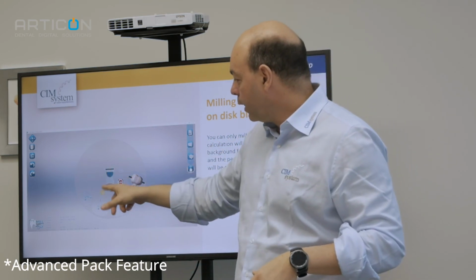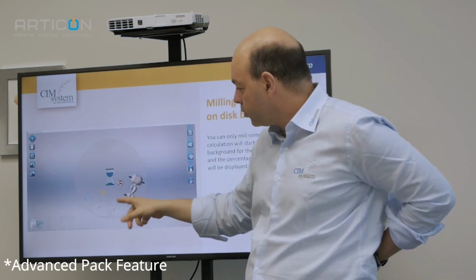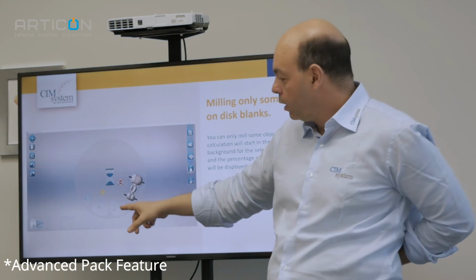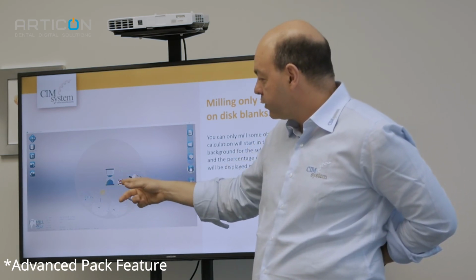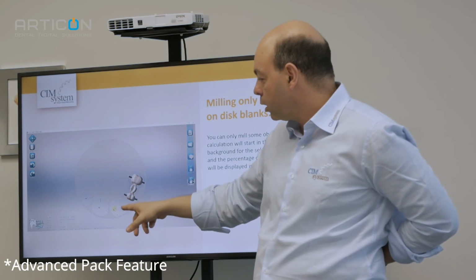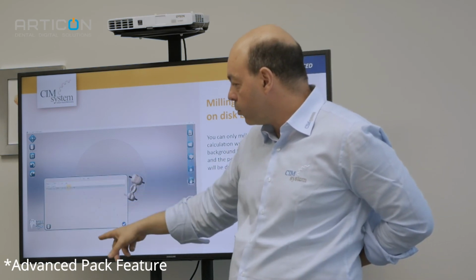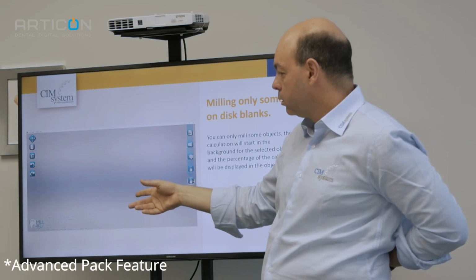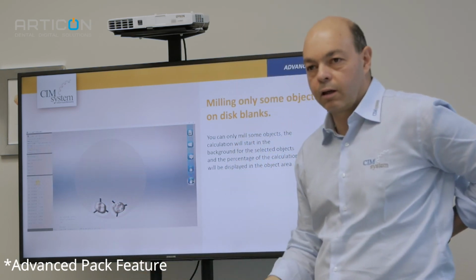Look, I have 3 calculated at the same time. This, and this. When I finish, everything is okay. He puts one check. If I need to check this project, it's easy because after calculation, I click here, and automatically I have the information. If I need, it's possible to open this project with another Millbox. Okay, and I check. I show the simulation and I check everything.